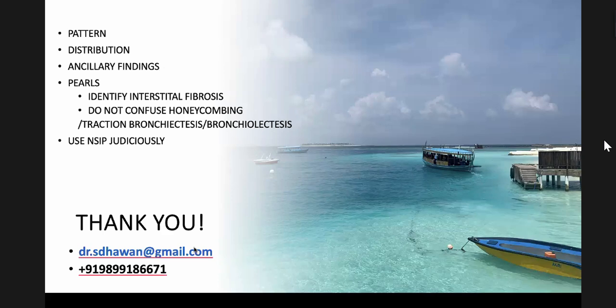As a summary, whenever you deal with interstitial lung disease on a HRCT chest, look at the pattern, look at the distribution, look at the ancillary findings like lymphadenopathy, pleural thickening, esophagus, bones and joints. And what is important is to identify fibrosing lung disease.